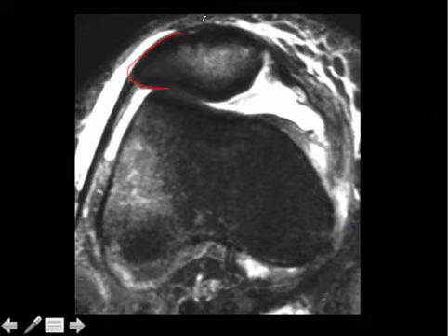So notice that there is a contusion here and a contusion here. So like this thing slipped off here, banged into that, and then got pulled back across. In the meantime, because it was going this way too far, all this got torn. So that's all hamburger. So this is a patellar dislocation. Pretty much always occurs lateral. And then when you do it, you tear this thing here, which is your MPFL, medial patellofemoral ligament.